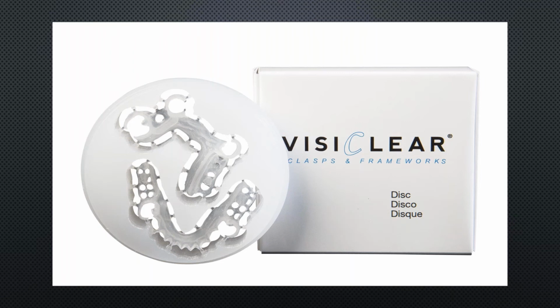The VisiClear, we'll talk about that here in a sec, doesn't absorb any moisture, and therefore can only really stain on the surface if it's not taken care of. And if it does happen to stay on the surface, usually with a cleaner or repolishing, it comes up just like the day it was made. So, this is different than a lot of the clear materials you've seen, and better. So kind of talked about the amorphous.